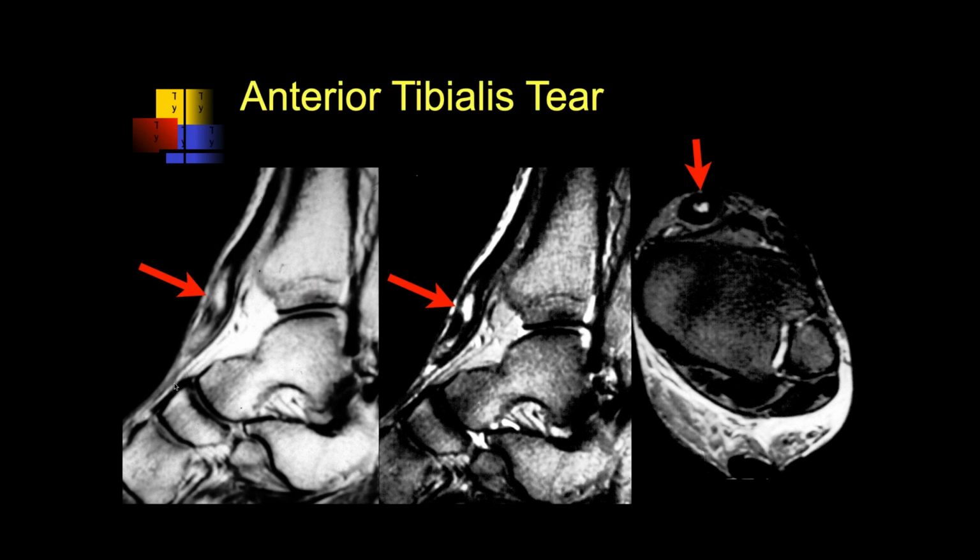Yeah, so this was a tear with just some proximal retraction, and obviously it was a tear into an abnormal tendon, as we talked about before, as has been shown in the shoulder. These tendons, normal tendons, don't tear. It really requires either something like a sharp edge to cut it, or you get a tear in the underlying tendinosis within the tendon.